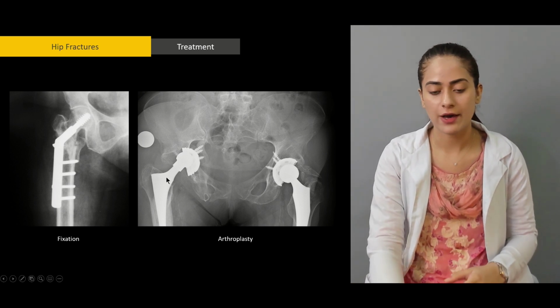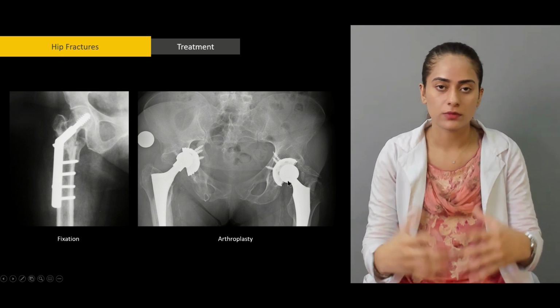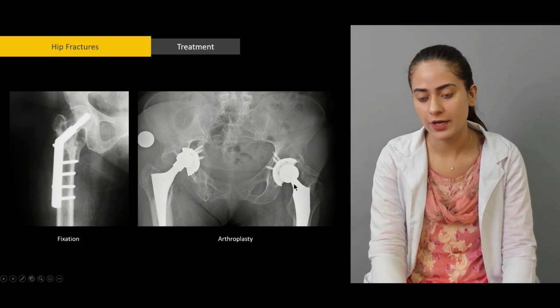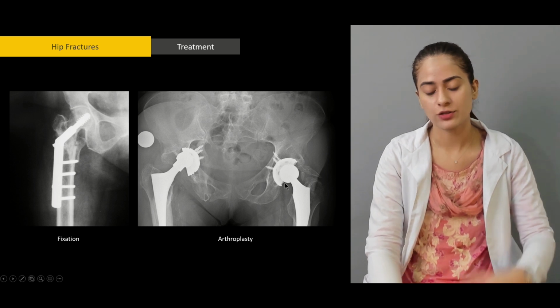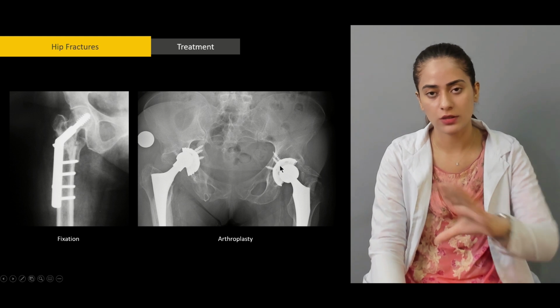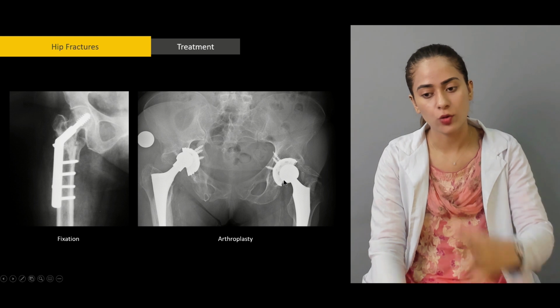What they do is they do an osteotomy, and they take out the head and all the areas of the bone which were degenerating or were severely fractured. So here we can actually see the fragments of the fracture. So this is a new arthroplasty. This is a total or complete arthroplasty in which there is a foreign acetabulum. It's not the natural acetabulum. We've made this acetabulum artificially, and then we have made this femoral head-like structure.